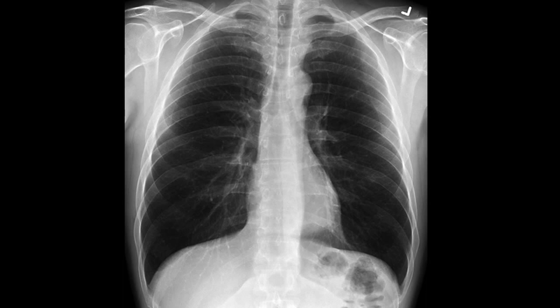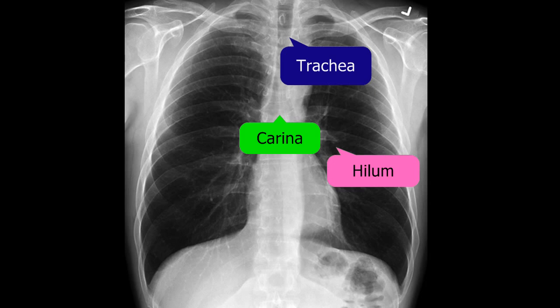Moving on with our X-ray topic, let's discuss A, the airway. Remember, as I said, airway includes the trachea, the bronchi, the bifurcation point of the bronchi is called as the carina, and the two main principal bronchi. Let's have a look at the X-ray and try to understand what all features can you diagnose by looking at a chest X-ray, the airway part of it. An airway is basically three things put together: trachea, carina and the bronchi, and of course their entry point into the lungs called as the hilum.